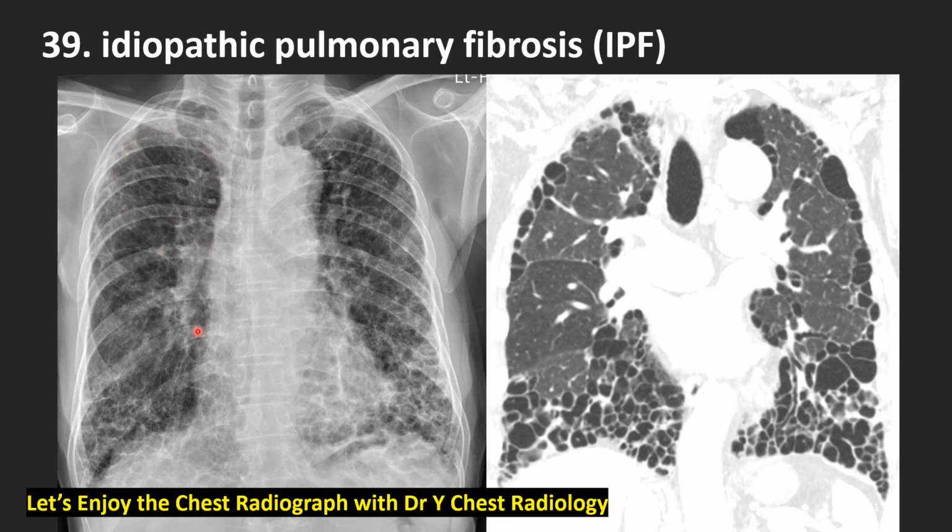Fibrosis, honeycomb, fibrosis, honeycomb, basal dominancy, posterior dominancy, subpleural dominancy, honeycomb lung. This is the famous IPF. He used to be a heavy smoker, an old-aged man.